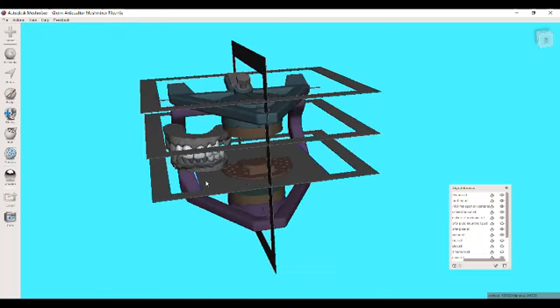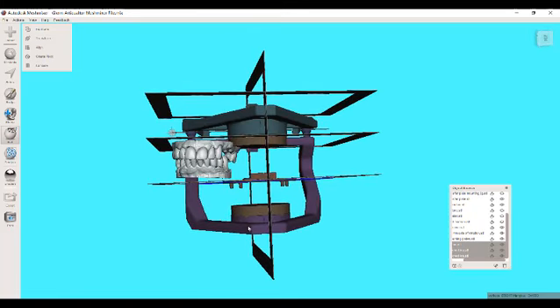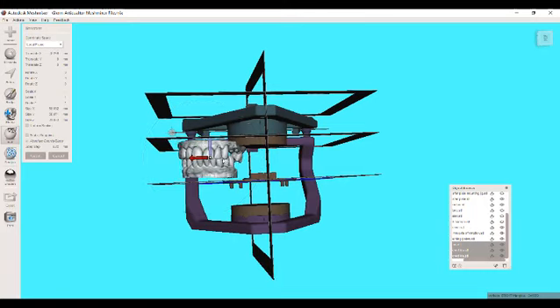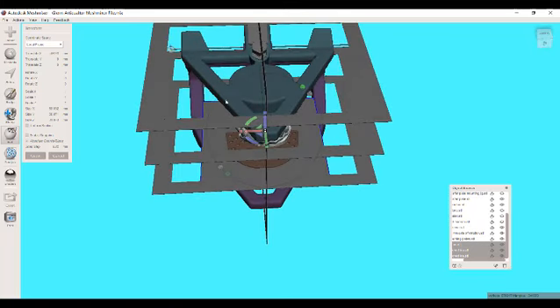Now, first thing that you ought to notice is that these are not oriented in the same scene. Okay, and that's always going to be the case because all CAD programs have their different definitions of what's up, what's down, forward, back, all of that. And so when you bring this into the articulator file, assuming you want to align it to this so you can print your models and have them oriented properly, then the files that I brought in, I just want to control select all of them and now move them together. At least in Mesh Mixer, if you move one and you don't have it moving with the others, then now you've lost their orientation to one another.